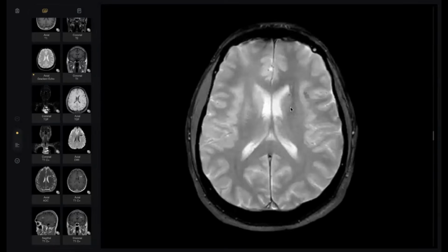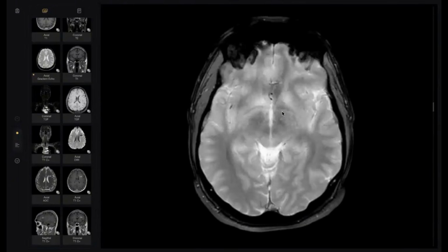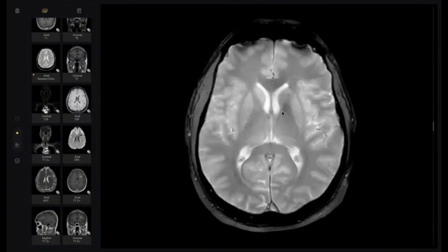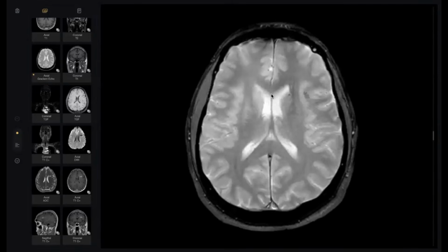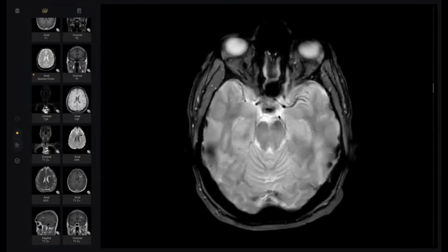Then all these medullary veins are collected subependymally. And after that, of all these deep veins, there are three major veins that come from the ventricle and are collected at the venous angle here.